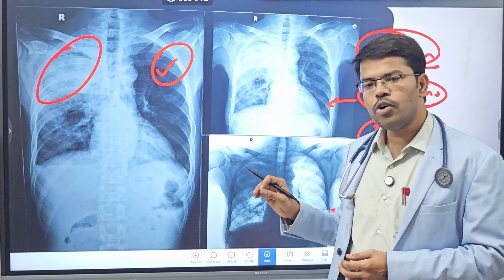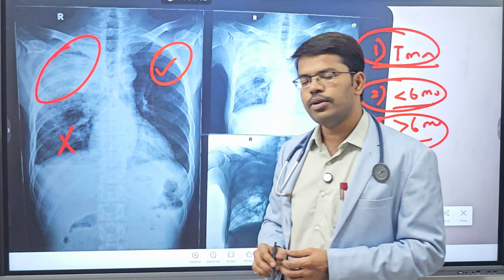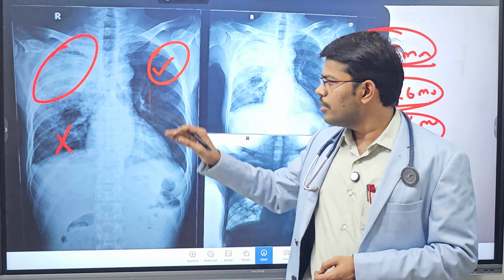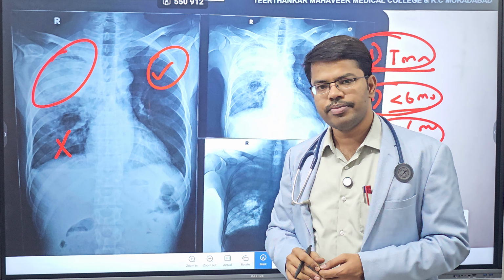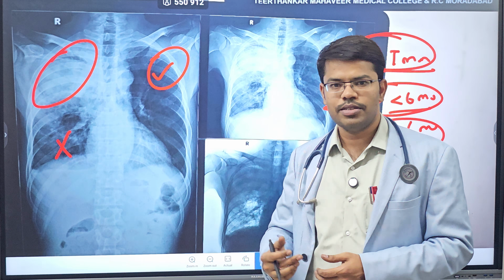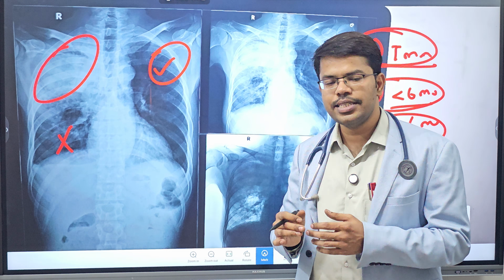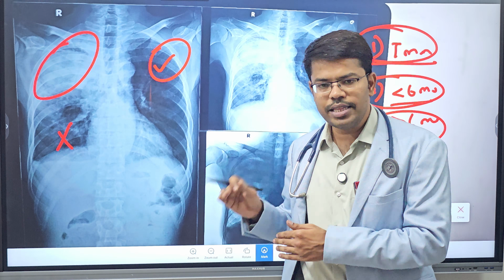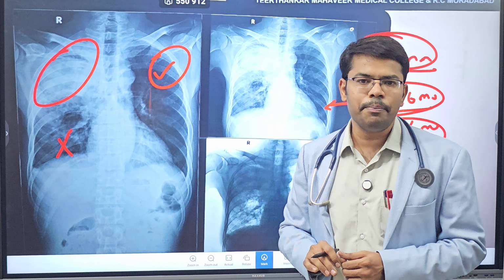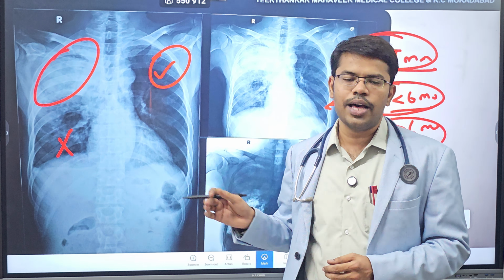Suppose the patient is immunocompetent, you might see lobar pneumonia in the lower zone. Why lower zone? Because of the dependent position, lower zone pneumonia is common. Whenever you are getting upper zone involvement, if TB is ruled out, TB, you know, upper zone is prominent because of the blood supply and oxygen difference; that's why upper zone is common. If you take only lobar pneumonia, this is more common in the dependent zone. If you are getting it in the upper lobes, mostly it is an immunocompromised situation.